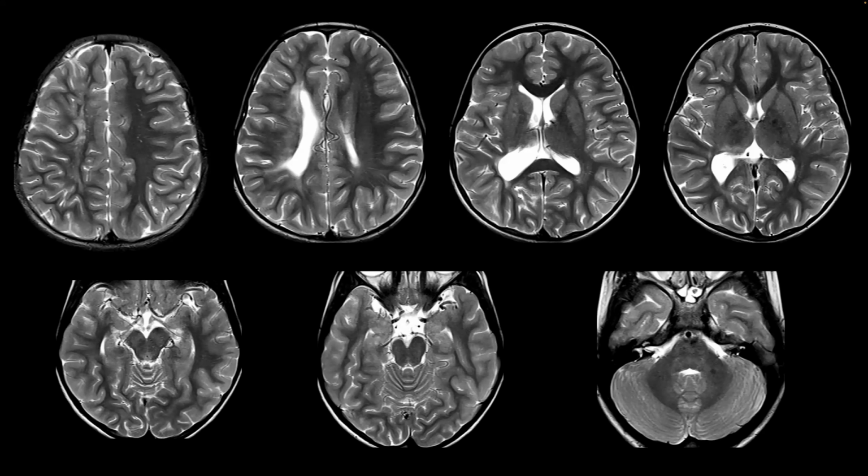On the right side you have these hyperintensities or gliosis with reduced white matter volume in the frontal lobes, and exaggerated dilatation of the ipsilateral ventricle. There's some degree of volume loss or Wallerian degeneration along the corticospinal tracts. If you track it below, the ipsilateral midbrain also demonstrates volume loss. There's gliosis in the right periventricular deep white matter, the frontal region, temporal lobes, and also some degree of gliosis around the pulvinar and thalamic nuclei.